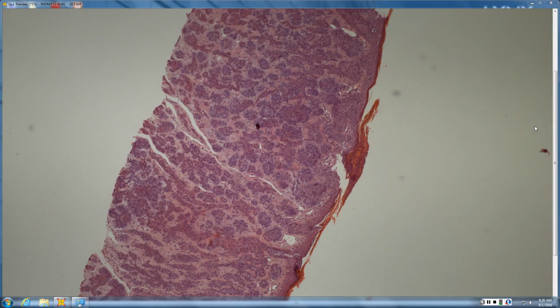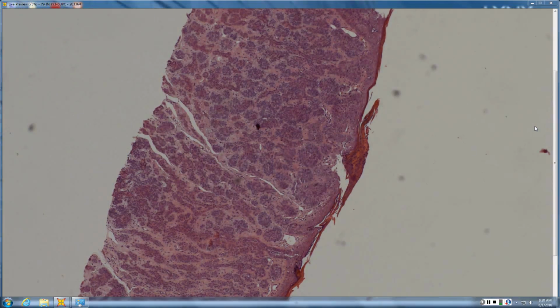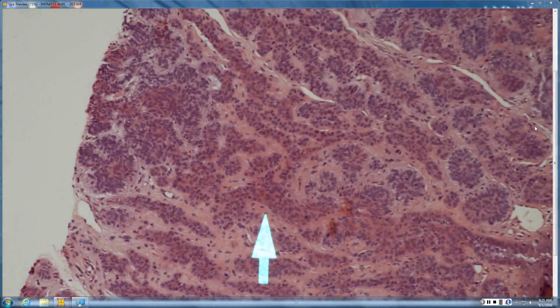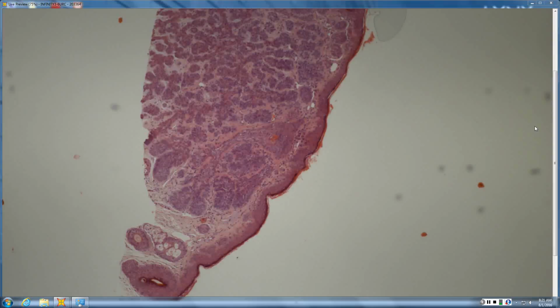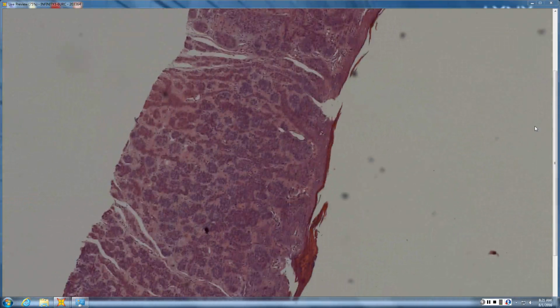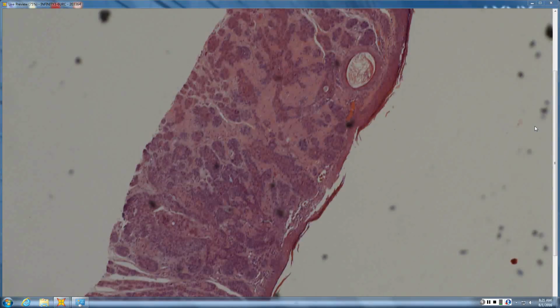So it looks like we've got little islands of blue cells that seem to be coming off the overlying epidermis. Are the strands blue or are the strands pink? You've got pink strands and some blue buds. Tell me about tumors with pink strands and blue buds. You have fibroepithelioma of Pinkus, and then you could have, was it infundibulocystic BCC?